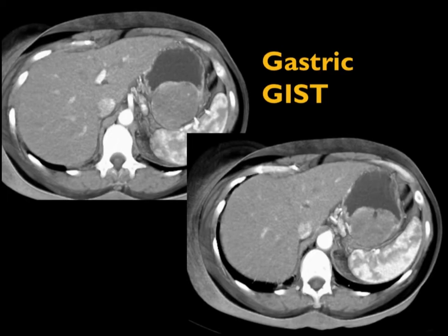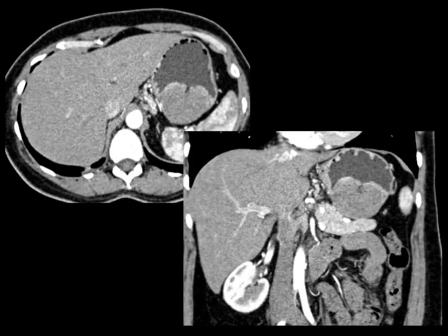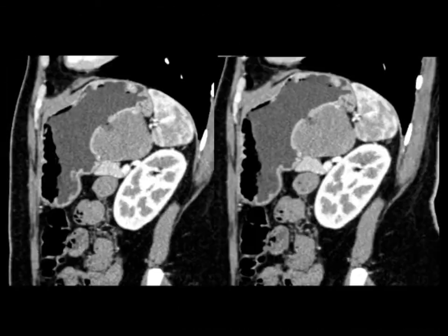When you look back at other cases we can talk about here, large, bulky, exophytic lesions with ulceration. This is when I'm typically thinking about gastric GIST tumors, very nicely shown here, and here it is on the sagittal view. I think one of the challenges sometimes with GIST tumors when they're exophytic is determining where they're arising from. They're so exophytic, sometimes you can confuse them with pancreatic masses or retroperitoneal masses or even adrenal masses.